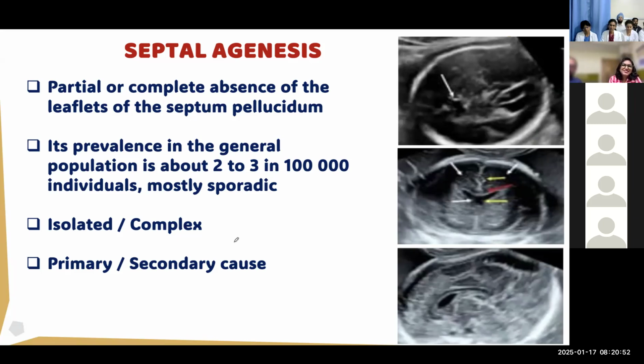Barometric? Those are very scary words. What does that mean? Because of the pressure it ruptures, right? Yes, basically it is a pressure effect. Severe ventriculomegaly causes secondary destruction of the CSP and corpus callosum because of increased pressures. This causes fenestrations in the septal leaflets, leading to obliteration of the cavum septum pellucidum. Okay.